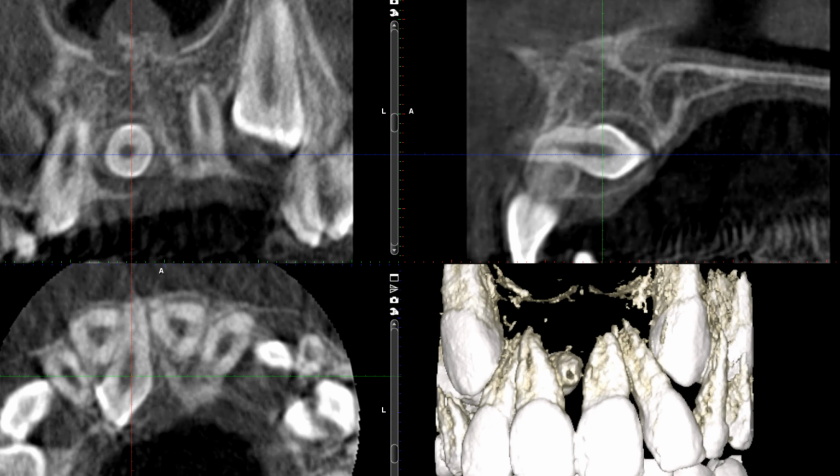So there you go. So this is a CBCT. Again, we're seeing axial view here and the coronal and then the sagittal view, and I basically put the crosshair right directly over the area of interest, and you should immediately be able to tell that the crown is in fact facing palatally, okay, along the palatal cortex, so much so that it has caused the expansion of the alveolar process and significant thinning of the palatal cortical plate.